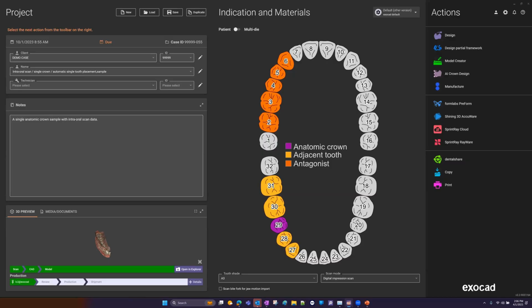How long does AI take to design? Typically what I see is roughly a minute and 30 seconds till you get your proposal. Obviously that depends on your internet speed, but in my office I'm not running fiber or anything like that. Mine's pretty moderate when it comes to what's available from internet providers these days.